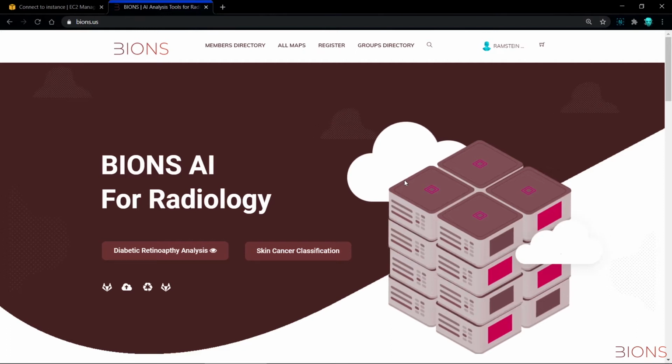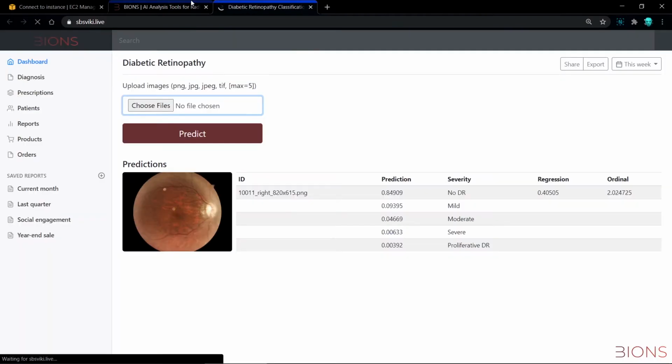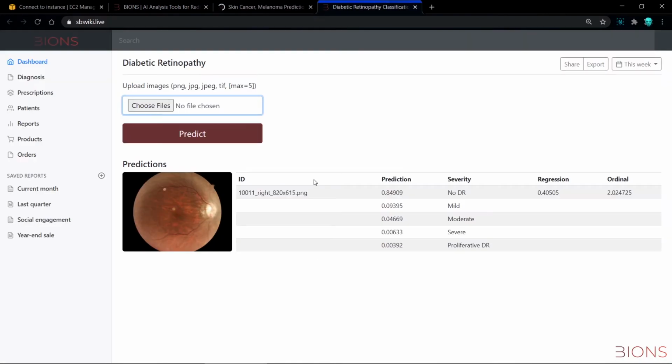Hello, I'm MD Jishan from BIONS, and in this video, I will be testing two BIONS products: diabetic retinopathy analysis and skin cancer classification. Let's just start both of the products right now. So both of the products have been started.